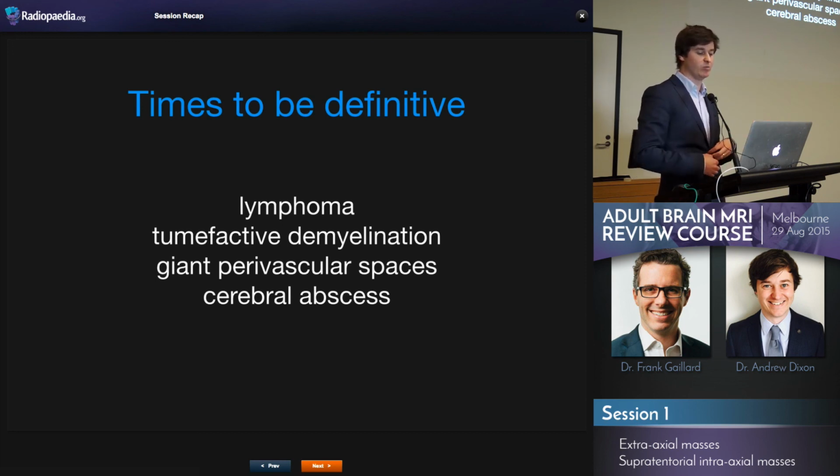We haven't come to cerebral abscess yet, but that's the fourth one that I think you can really, as a neuroradiologist or a radiologist, come down hard on: is this an abscess or is it not? Because it's obviously going to expedite the patient's care if you think it is an abscess.